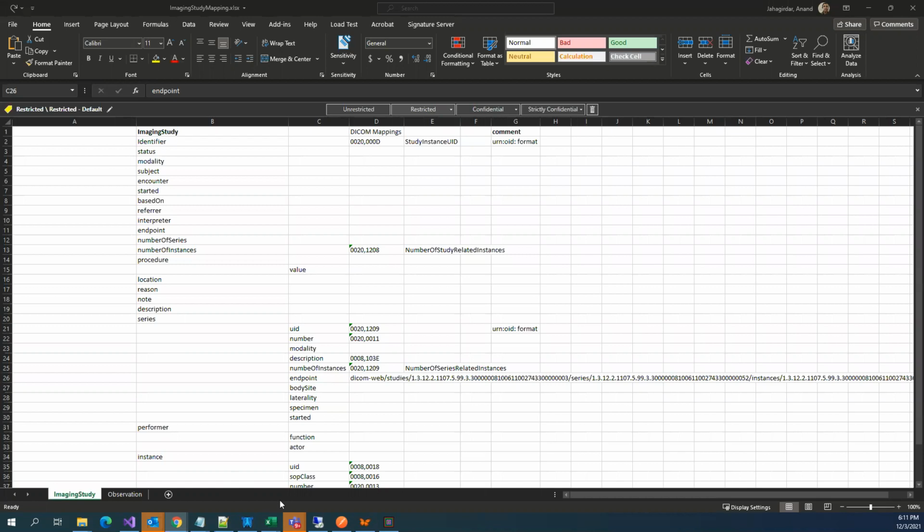As I said, imaging study is quite established, but for DICOM SR to imaging, I think we have to see how you consume that one. So that's the reason in this Connectathon, I was thinking of stopping at showing those measurements on Postman or some kind of application, just to display it and stop there.